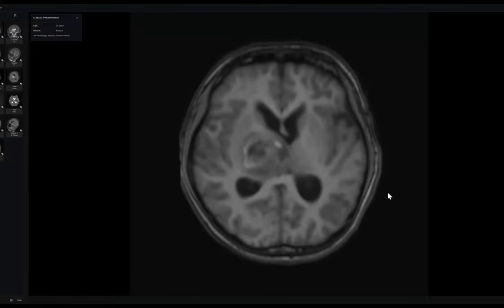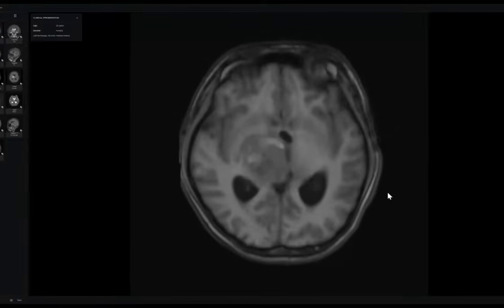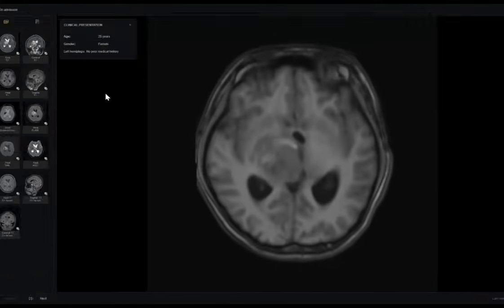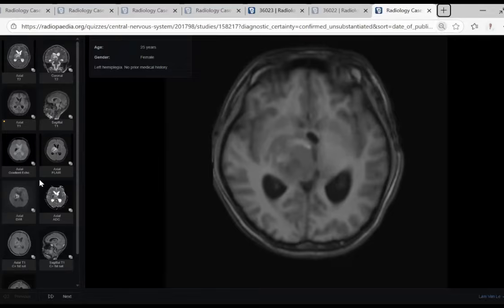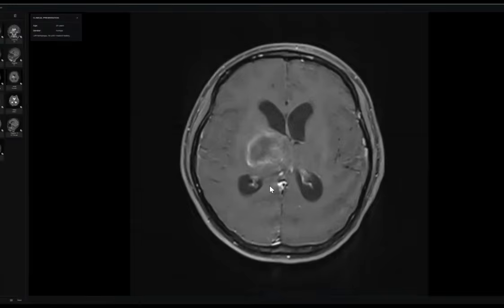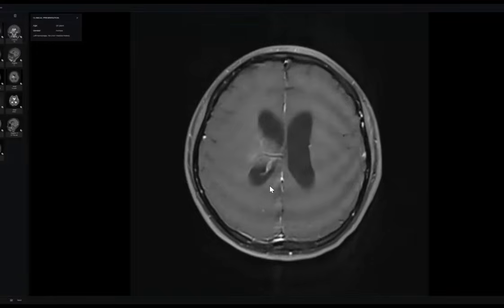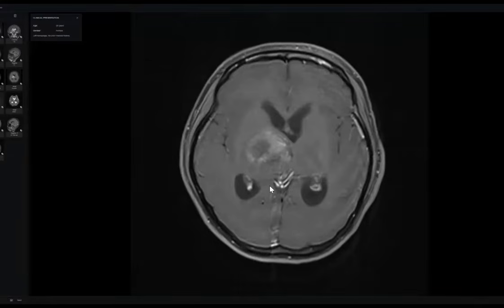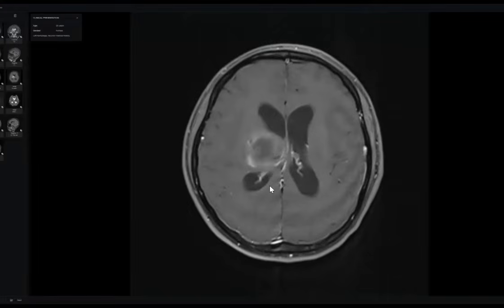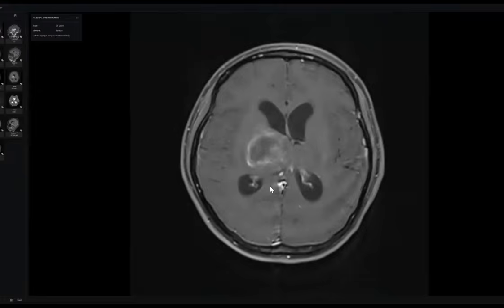Yes, but I didn't give you any post contrast. How could you speak about vascularity? You're right. Can I please see the post contrast? Okay, this is the post contrast. So don't speak about the vascularity before. Okay, what happened? Do you see the lesion? Yes, the lesion is having rim enhancement with central no enhancement or low enhancement. So I would like to also look at diffusion restriction.